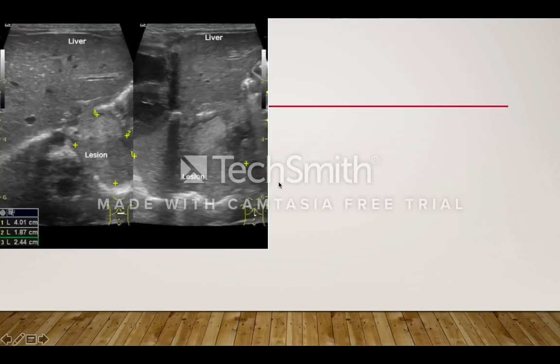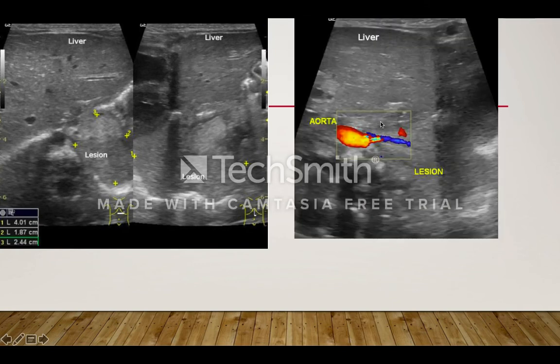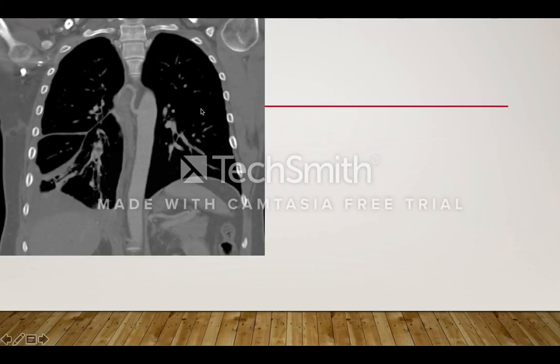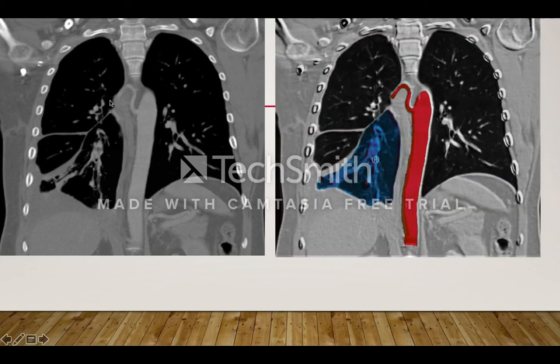The same patient postnatally after delivery shows that well-defined echogenic lesion in the left lower lobe. In the color Doppler ultrasound, it shows that there is an extension of the vessel to the lesion. This is a coronal view of an adult patient, showing a dysplastic segment of the right lower lobe, and there is an extension of an arterial feeding vessel from the upper thoracic aorta, well annotated in this image as well.